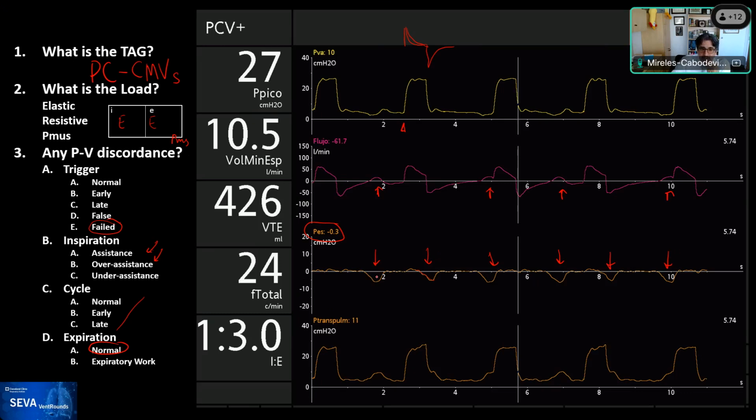respiratory muscles are generating. And then on the bottom panel, you can see that the transpulmonary pressure is the manifestation of the pressure of the airway. So the pressure inside the airway, so the pressure in minus the pressure outside.